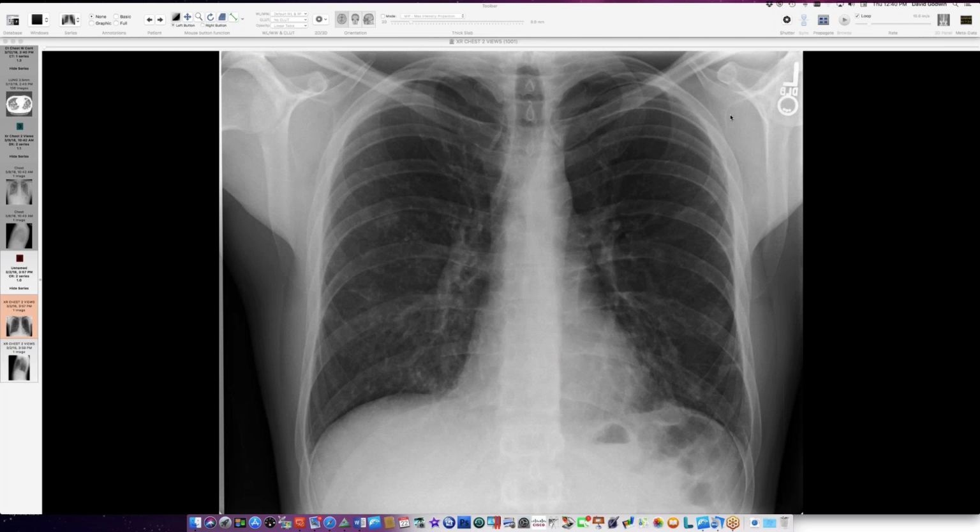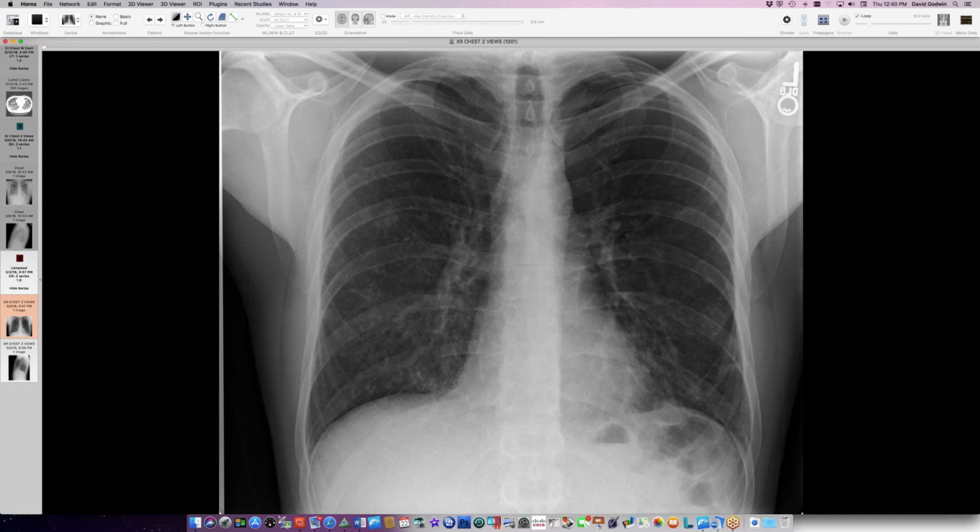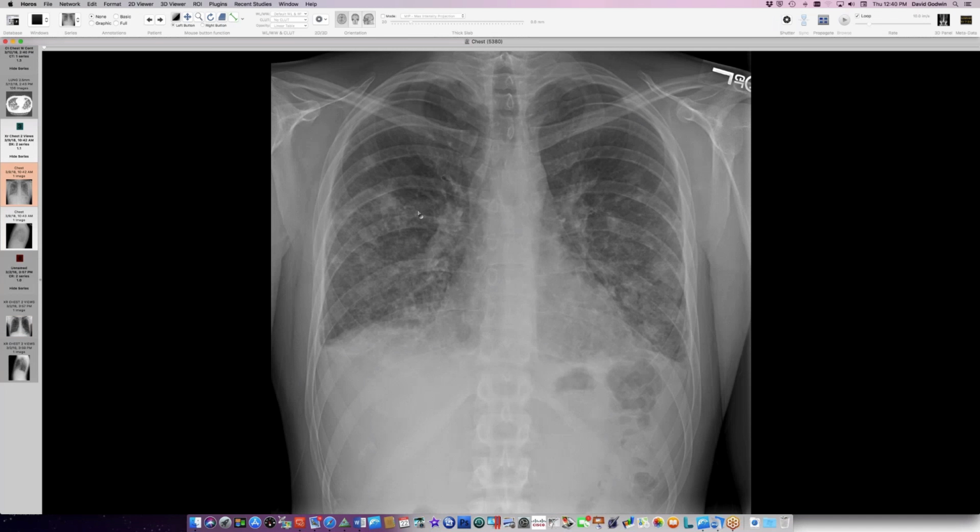Yep. Okay. So this person presented to an outside clinic here with some dyspnea and had this radiograph, and you can see that there's just some subtle patchy consolidation here, nothing too striking. But a few days later, a week later, you can see that things are now pretty impressively worsened here, and there's probably some accompanying pleural effusion.